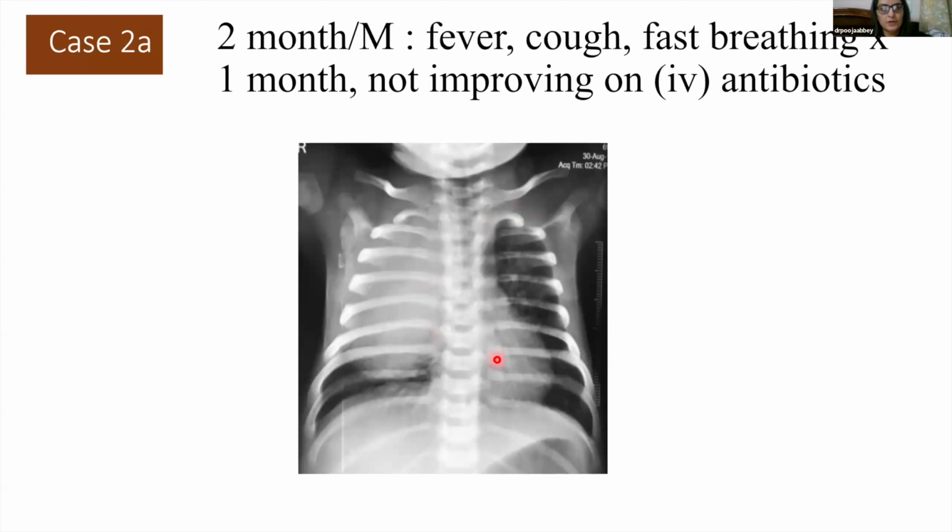On this frontal chest radiograph, we see this very homogeneous kind of opacity, which is involving the right upper zone, mid zone, part of lower zone. It has a convex lower margin. We're not able to appreciate any air bronchogram. We're not able to appreciate any frank cavitation. And the left lung appears normal, CP angles, everything looks normal. Not too much of mass effect, which is evident here, maybe a little.